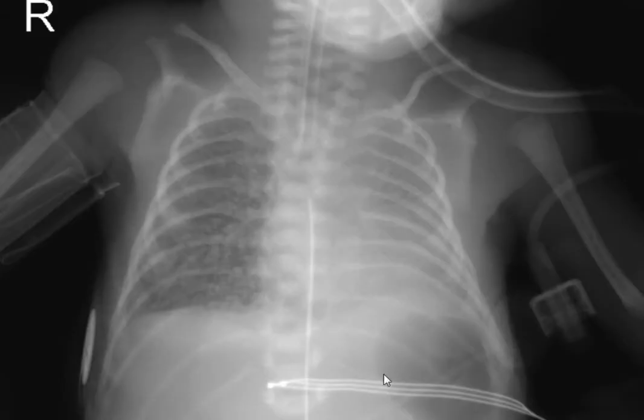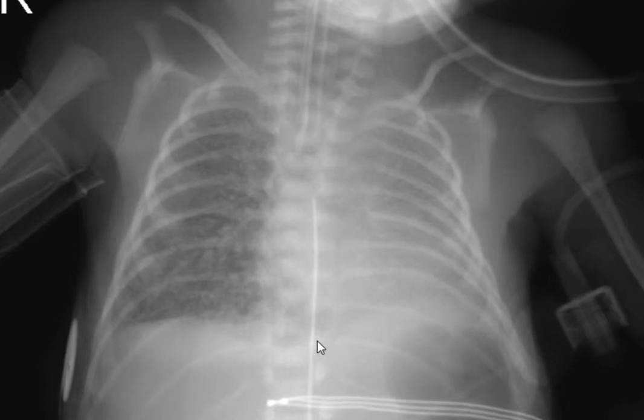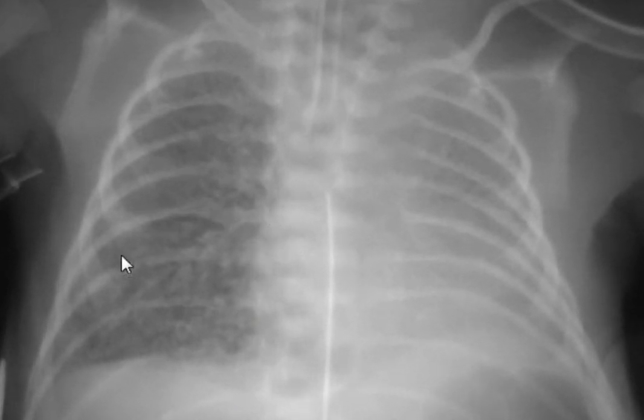This is a more dramatic and obvious example. This is a patient that has interstitial emphysema pretty much throughout the right lung, but particularly in the mid and lower lung field. Again, some of these look like air bronchograms, but you don't see the exact size and number of air bronchograms in the contralateral lung. So this is linear and some cystic interstitial emphysema involving the mid and lower lung field, and to a lesser extent the right upper lobe, because the whole right lung looks more lucent than the left, and it doesn't appear to be a result of technical reasons.